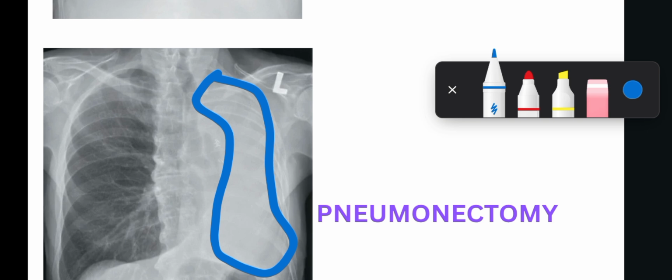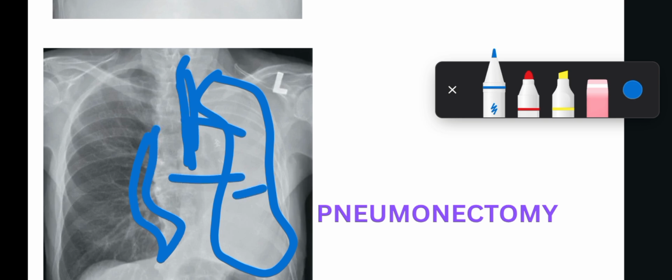It is difficult. Of course, we see that the mediastinal structures, it pulls down towards the area of the lung that was removed. You can't appreciate any right heart border. They have been pulled out this area. So these are tiny things we need to know to be able to make the right diagnosis.